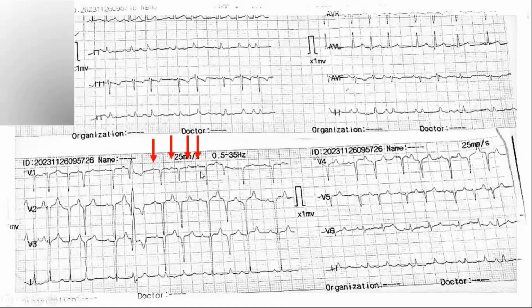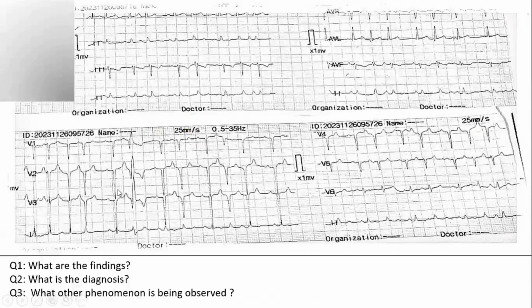Yeah. So many APCs at the same time is unlikely, no? This means there's some tachycardia going on, and sometimes it conducts very well, and sometimes it doesn't conduct very well. It gives some pause. So you can see what the question was: what are the findings? You have to write it because the questions are laid out, so the answers are according to those questions.